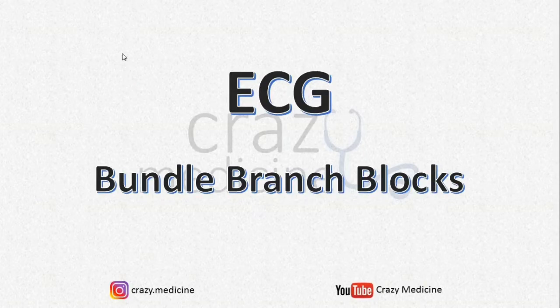Hello friends, in this ECG video, we will discuss bundle branch blocks in a conceptual way. Do watch the full video for complete understanding.